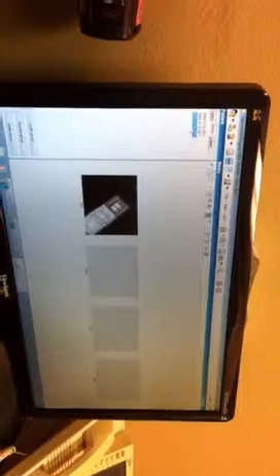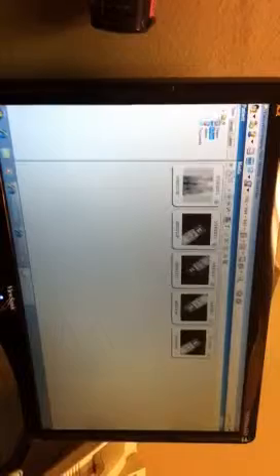This is the bitewing template. We opened it. We only exposed one, obviously, and this was the previous one when I was testing with the little thing, and this was the first one I tested with. Okay, so yes, it's grouped according to the template name that you gave when you acquired it, and time and date stamp. Okay. So under types, these are just single images. So when you go to X-rays right here, which is everything you took on that patient, historically, from newest to oldest. If you go to groups, you can see them by exam series.